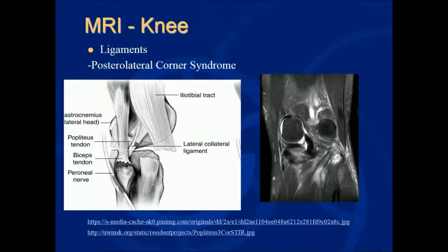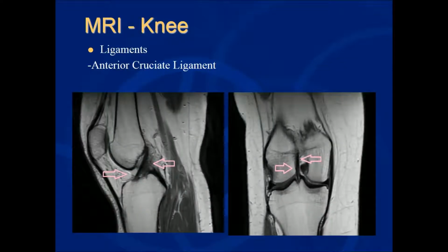Here's showing the torn ligaments there of the lateral collateral ligament. The image on the right is showing a significant edema of the fibular head.